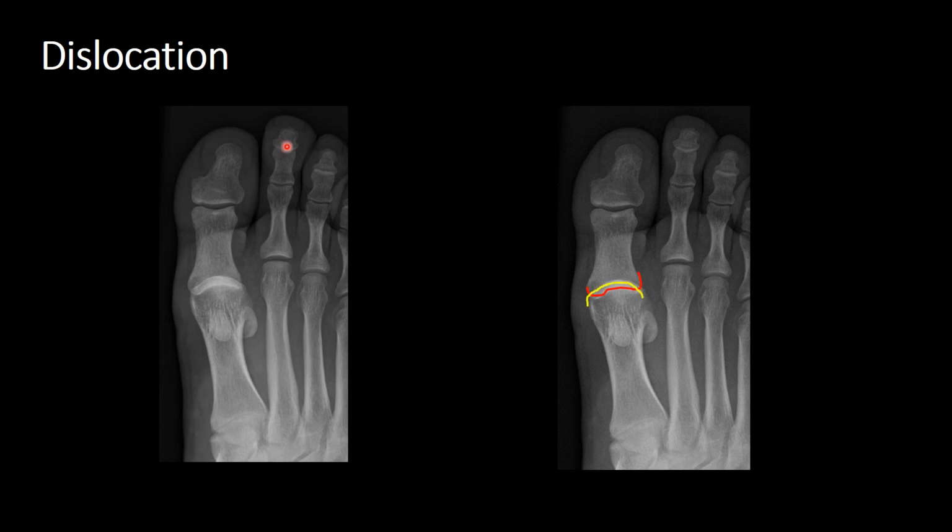The distal interphalangeal joints of the second and third toe are not well visualised, but that's because the toes are held in slight flexion, so you're not getting a true DP view of the DIPJs. But that's normal and mustn't be misconstrued as a significant injury. In comparison, however, if we look at the first metatarsophalangeal joint, we can see that there's no joint space at all. And more ominously, we can see that the base of the proximal phalanx overlaps the head of the first metatarsal. So this indicates that there's an abnormality here to the joint.